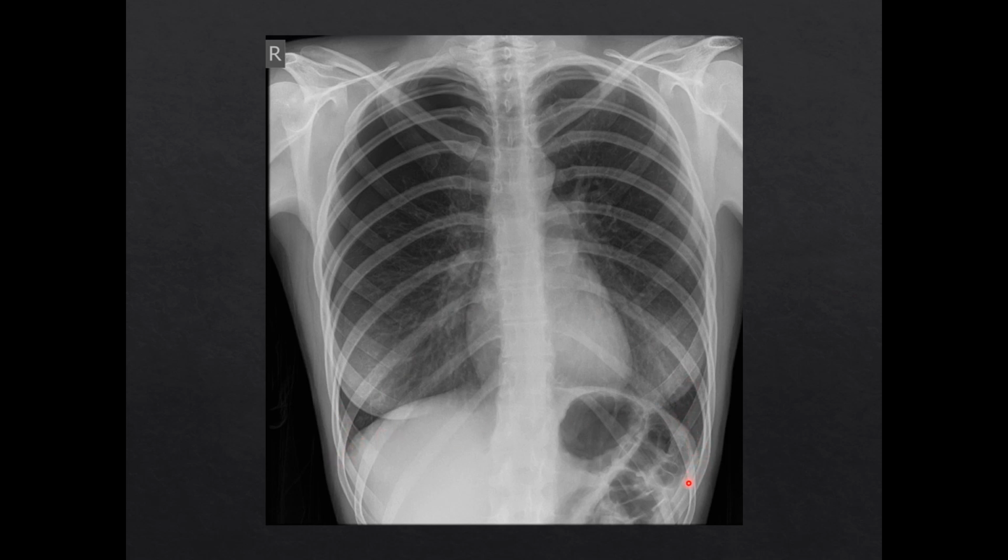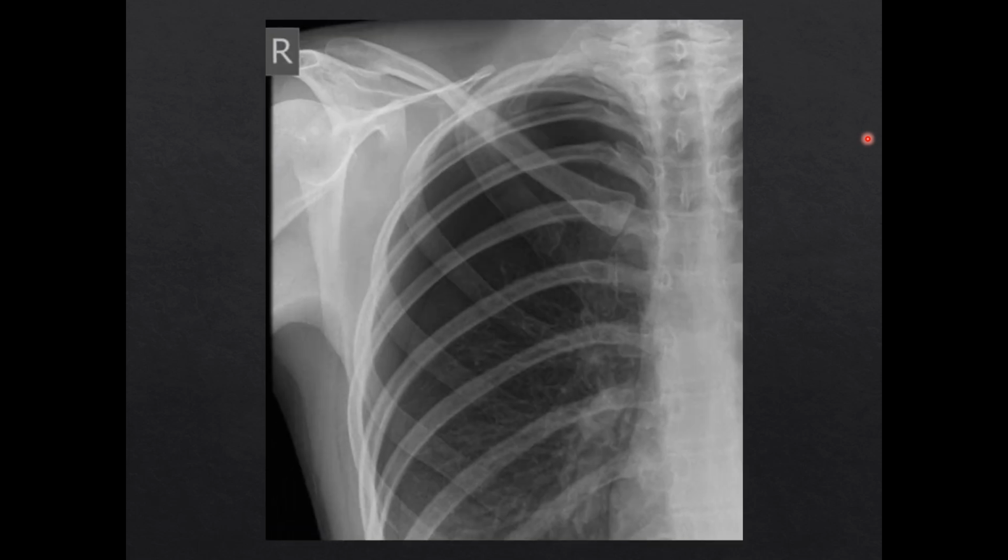Can have deep sulci when the patient is laying on their back. In this case, however, and in most cases I've seen, what you're really looking for is, in that erect chest x-ray, a crisp line denoting the edge of the lung that you can tell is the edge of the lung because these lung markings extend all the way to that edge but are not found anywhere on the other side of that very thin line.